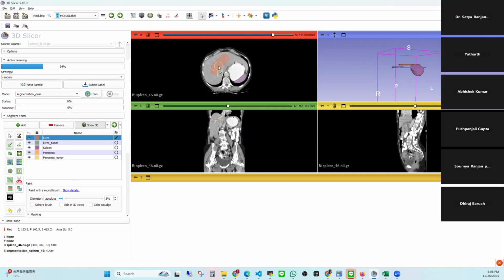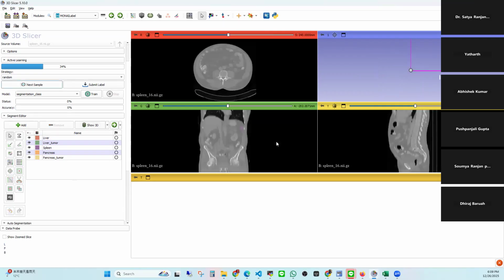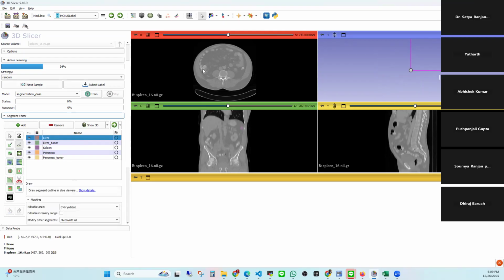When you click on this one, if I show you another example over here, the one I mentioned, until you click the lesion, these things won't be active. Currently you cannot edit using these points. Until you click on the lesion you want, or the other annotation you want to make, suppose liver, these are not active. Then you can just click on whatever annotation tool you want to use and continue annotation.